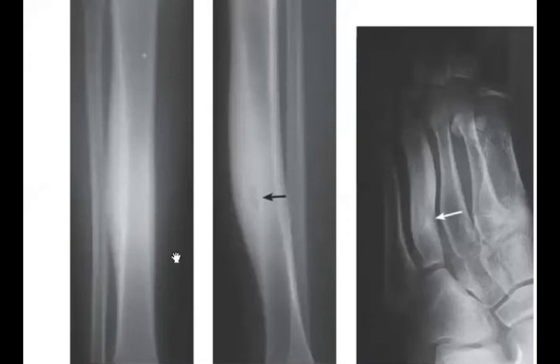So maybe you can start with the cortical thickening. Yeah, you go to the final diagnosis. Muhammad Zuhair, Justiana, Shayma, perfect. So yeah, you will mention the thickening, and he showed you already the lucency inside.